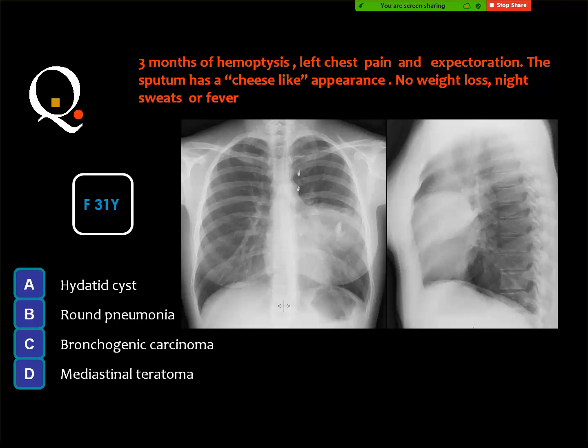Okay, but if this is in the lung, you may say that this is a bronchogenic carcinoma even in the presence of calcium. But what makes you favor the possibility of a mediastinal pathology? Wide relation with the mediastinum. Okay, but there is an important silhouette sign. Cardiac here, the left cardiac. The silhouette sign means that this lesion is anteriorly located.